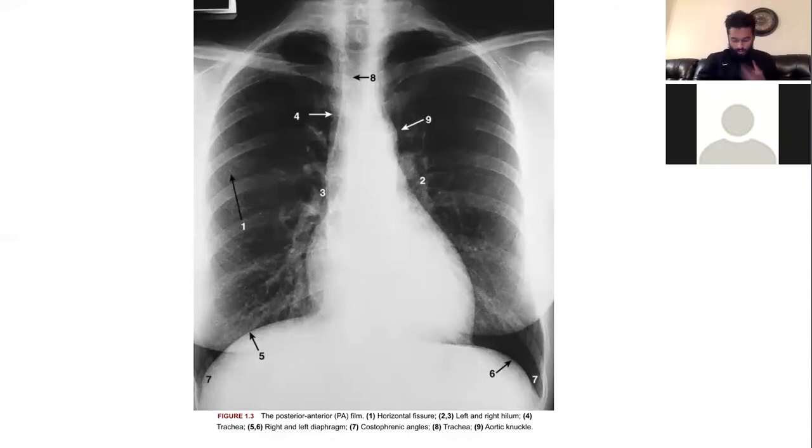I'm just gonna go through a few things to take away that are gonna help you out. One important thing that we notice with these is that you have to localize a lesion to see what lobe it is. You know what I'm saying? So I'm gonna teach you something that's really gonna help.